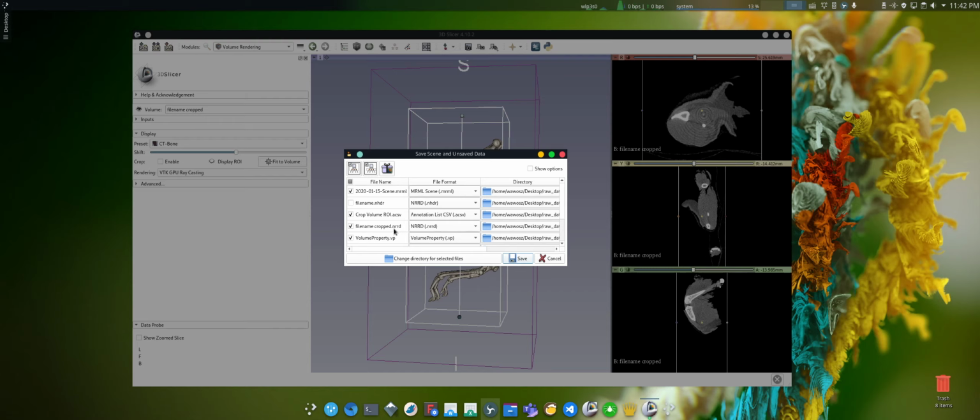As you can notice, it's a different format. It's NRRD. So we will need just this one file to open with Slicer. We don't need any header file or any binary file, because within this file we have both the header and the binary as one file.